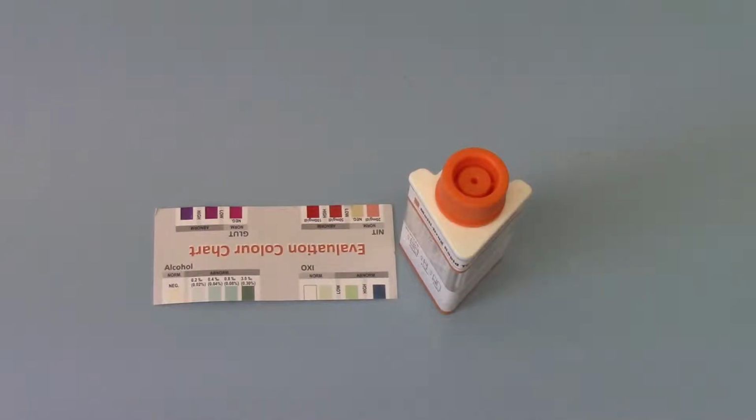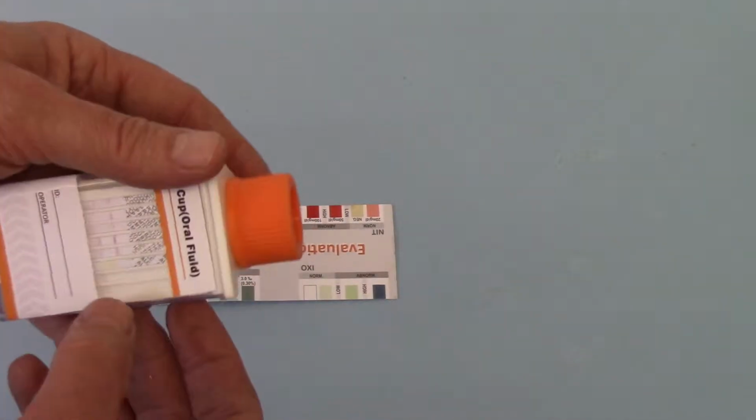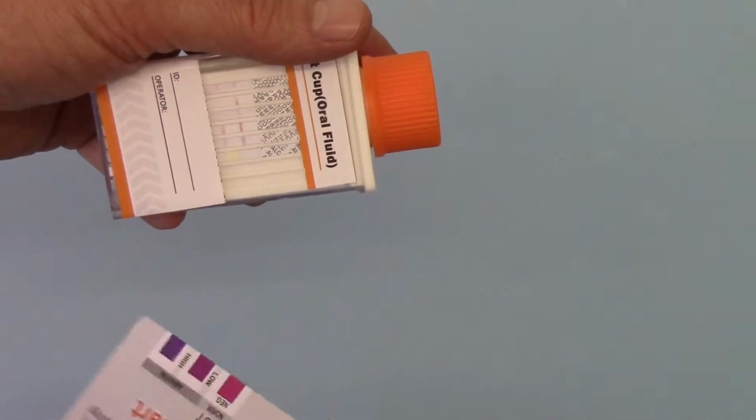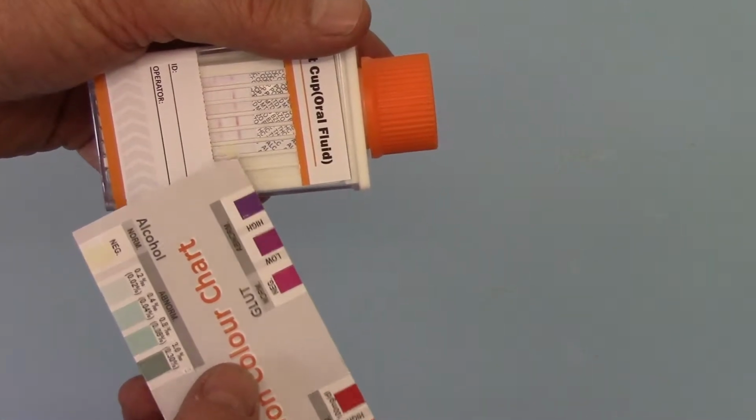Welcome back to the final part of this demonstration of the all-test DSD-8127-C new triangular barrel chamber 12 drug including alcohol. Now what we've done is run this test for between 5 and 10 minutes, and what we're going to show you first is the interpretation of the alcohol reading. The pad here, you can just make that out, I think, if I bring it into focus. This pad here on the alcohol test membrane.